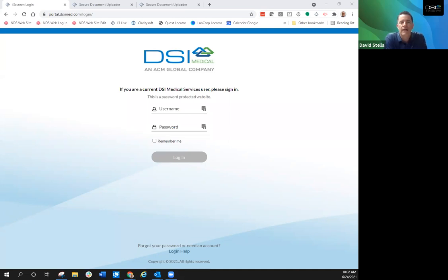So we're excited to show you enhancements to DSI Live that will really provide you with a better user experience and much better turnaround time on negative test results. Your feedback has been valuable in forming this version of DSI Live, kind of DSI Live 2.0. Today's training session will focus on the following tasks. Really the basic navigation within DSI Live, which primarily includes how to view drug screen results.